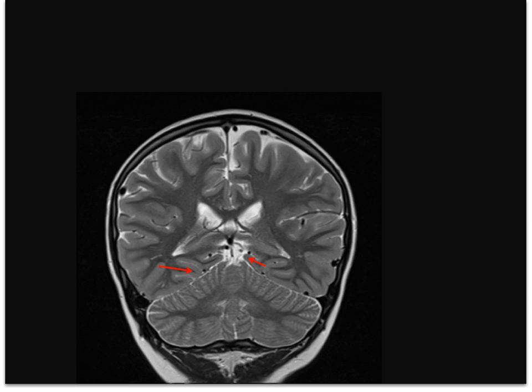Just lateral to the lingual gyrus is the occipitotemporal gyrus, which stretches anterior to posterior along the inferior aspect of the hemisphere. The midline portion of cerebellum is the vermis. Several constant deep veins converge to form the vein of Galen beneath the splenium in the midline. Is this a T1 or T2 weighted image, and how do you tell?